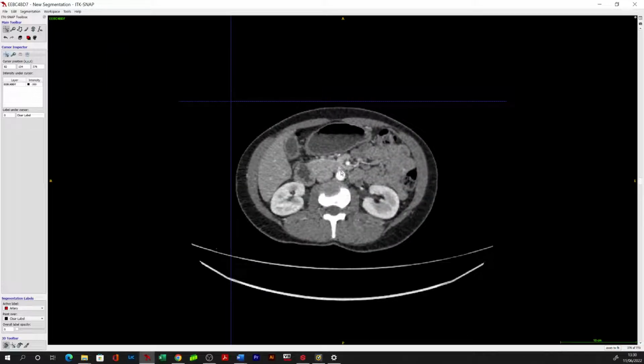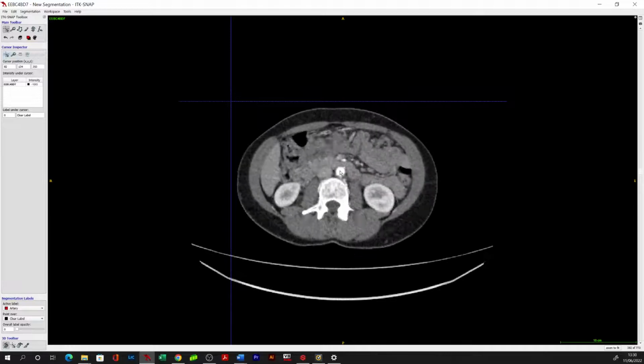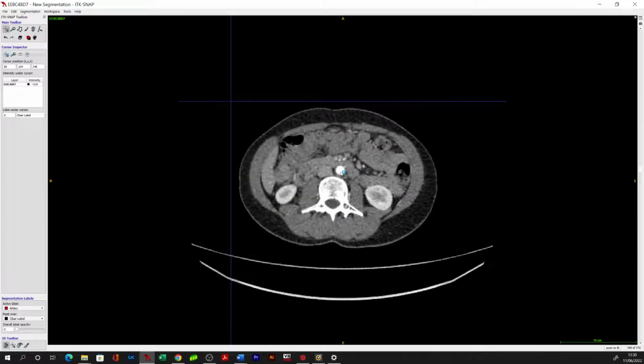I was quite zoomed in to this image, and actually in this situation it's probably making things a little harder. So sometimes there is value in zooming out, as it sometimes adds a little bit of clarity, certainly if you've got all the structures blending into one, because they're all essentially the same shade of grey.